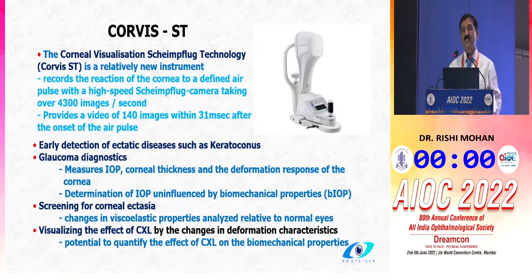And now the beauty of this machine is that it has now been clubbed with the Pentacam. So you can now get a combination of the two, which gives you topographic values, thickness values, and now biomechanic values, and they've all been clubbed together to make it easier for people like me to understand.